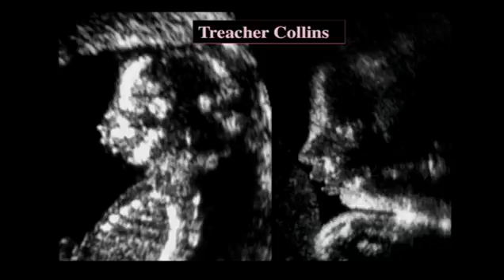Now going on to the next syndrome, Treacher-Collins syndrome, this is typically an autosomal dominant syndrome, so that you may have a parent that has it, that comes in with a 50% chance of passing this on. And what's interesting about these two fetuses is that they are two different families, and yet you can see how very similar those profiles look, with a small chin and a fairly straight forehead.